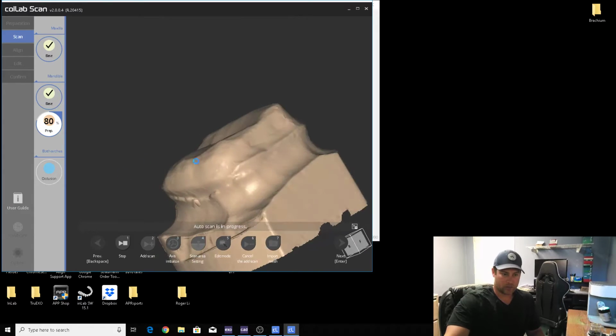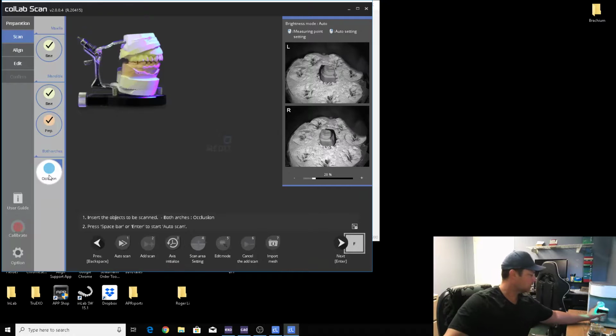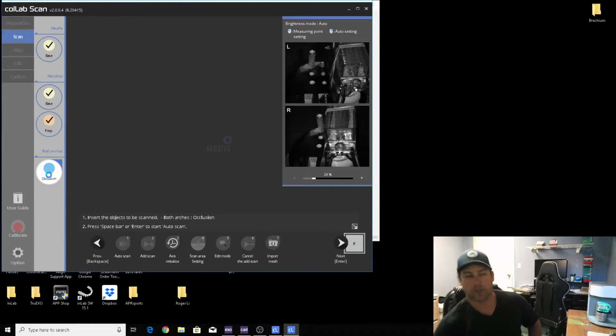More scan there. Make sure everything's all filled in. Everything's good. Alright, put this in upside down. There we go. Wait on that.